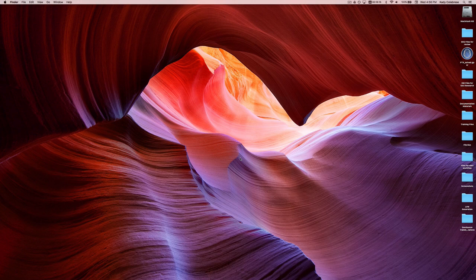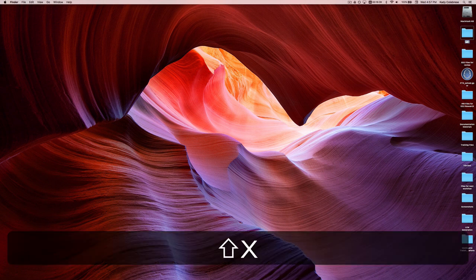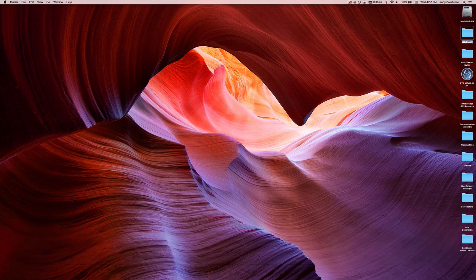Create a directory for your resulting files that will be the output from the MIP. Right-click and select New Folder. Name this folder that will contain the pieces from the MIP process. I'm going to choose PTX for the subject ID and then CAHM, the acronym for Conformal Atlas Head Model. Move the GPSR file you will be using to build the conformal model to this new folder.